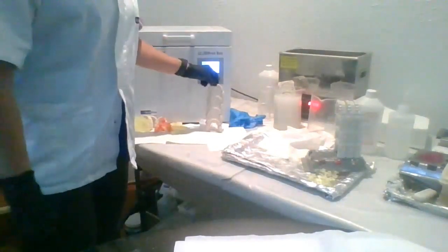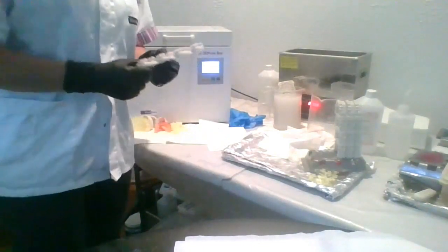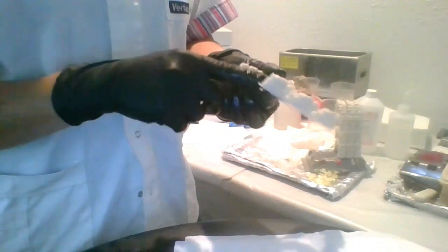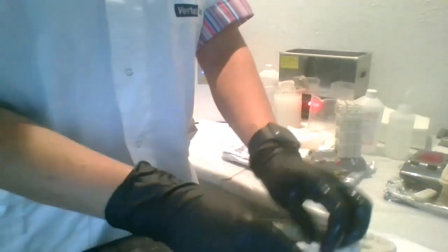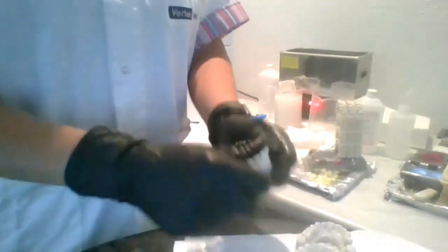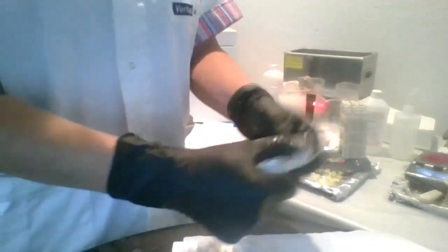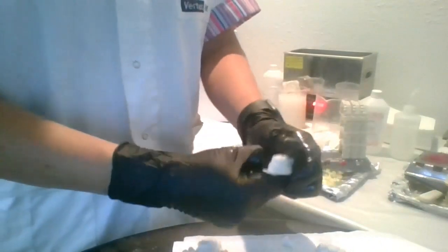Okay, so now you can go ahead and break these off before or after you put them in the cure oven. I choose to do mine after because then it's a nice clean break. And you can take out the lattice. I find that it looks nice and it looks fine, but these just snap right off. You can see there's no scarring from my supports. You can just pop these little guys right off on the sides because they're all perforated, basically. You actually use less material than you would if you're doing this in single level with all the other supports. You have less support material altogether and you have a faster build. Okay, so now you're ready to go in and do your thermoforming. If you don't like your lattice, you can also take that off as well.